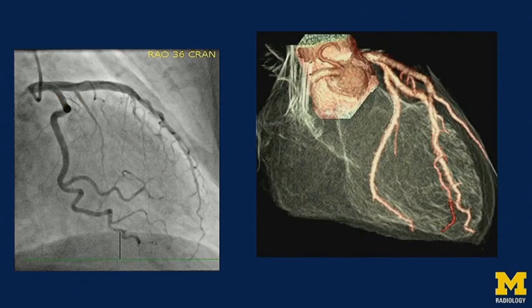And now the question is, what are these vessels that we are seeing? Can we identify these left-sided vessels? We can clearly see it's a left vessel, but which is the LAD, which is the circumflex? So remember, it's a right anterior oblique projection. So what happens is the interventricular groove, the anterior interventricular sulcus, moves out towards the margin of the heart. So this is where the anterior interventricular sulcus lies. So this big vessel that you see very nicely in profile is going to be your LAD.